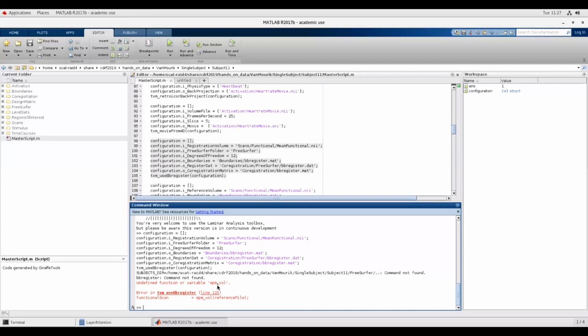Was SPM installed here? It's not on the list of things that people ask. Damn. That can be done quickly if you just want to take a 5-minute break for a beverage and catch up in a conversation. Yeah, I'm using all my 5-minute brain break. We'll get SPM installed for you. Okay, then we're very quickly going to install SPM. How can we do that? I don't know where to install it so that everybody can see it.